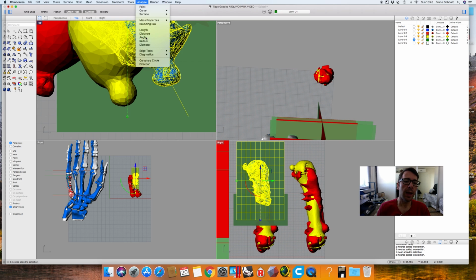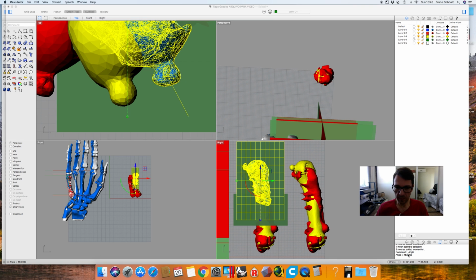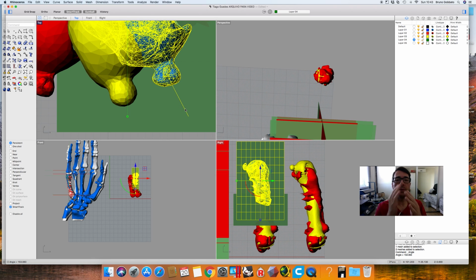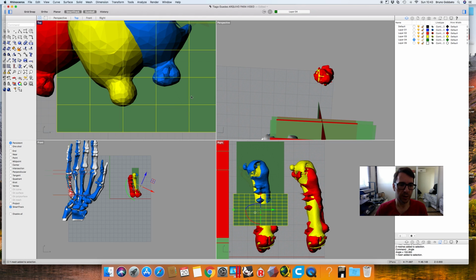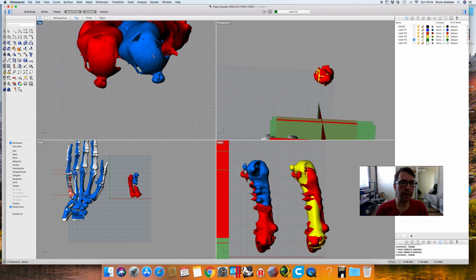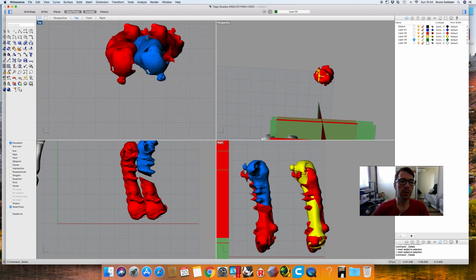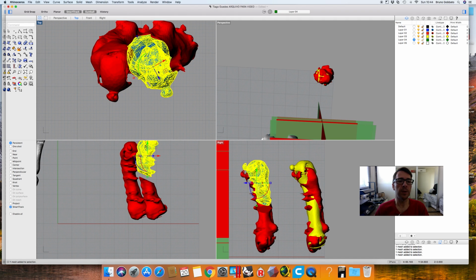So let's analyze angle, one point over here, and then the other point perpendicular, and we have 153. So 180 minus 153, we have a 27 degree deformity. So we have a 27 degree rotational deformity to correct in this patient. So this is how we think it should be. Let's move back down. And for correcting this patient, we should correct the shortening, but also the rotation of this metacarpal bone by 25 degrees.